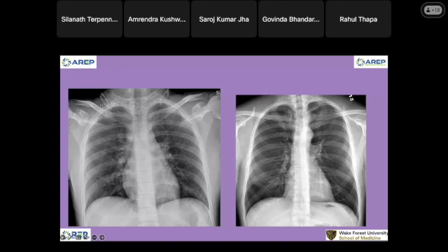That's normal. This is the fat plane. This one is very subtle. This looks a little dense. We're not going to see anything on chest radiograph. If there is a little opacity here, as I told you earlier, we are responsible for everything on the chest radiograph. Everything.